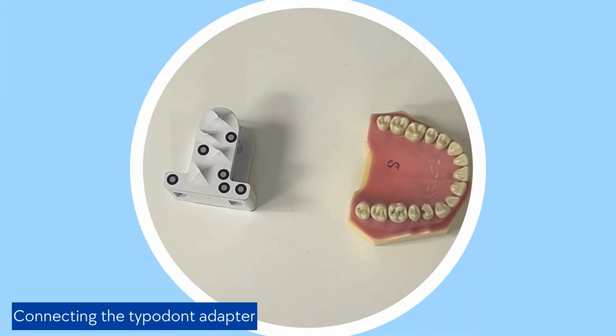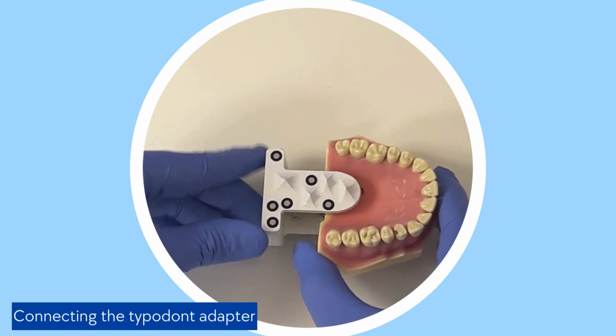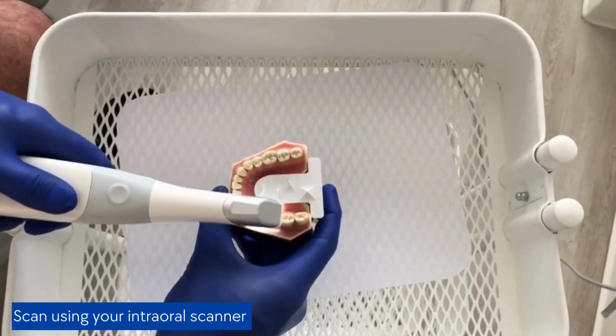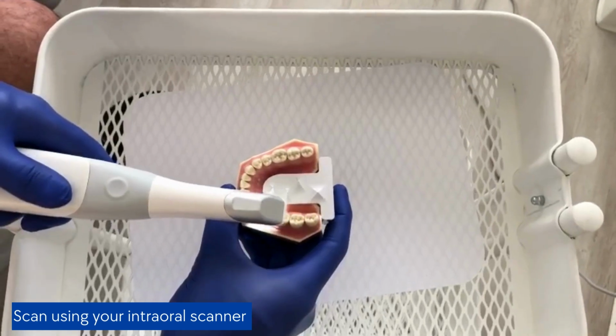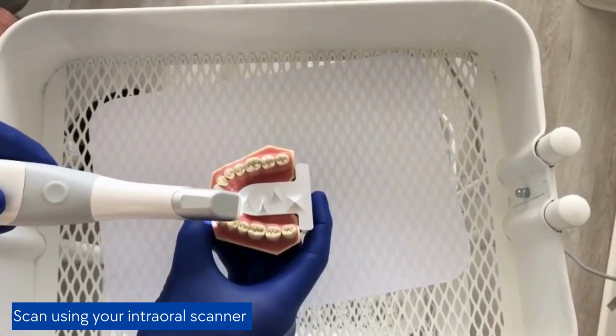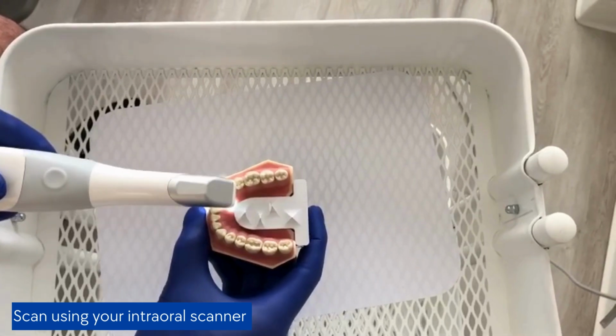When using your own intraoral scanners, you will need to attach the typodont adapter to your lower or upper typodont to ensure accurate calibration. Then, use your intraoral scanner to scan the jaw. In this case, we are using a 3-shape intraoral scanner. Once the scanning process is complete, you can import the STL file into our patented PrepScanner app.